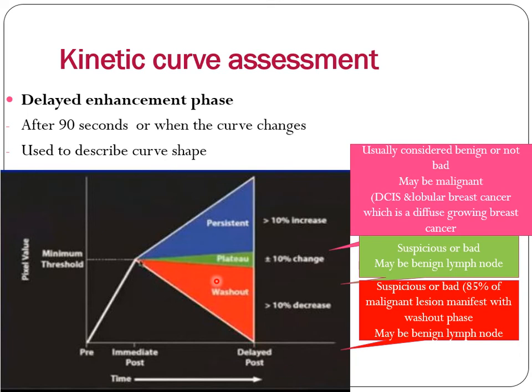Yes. The more you go from persistent to washout, the higher the probability of malignancy. The more the delayed enhancement goes down, the more the probability of malignancy increases.